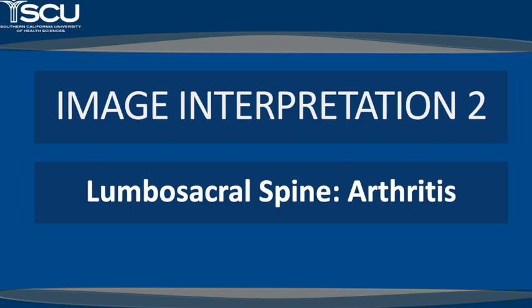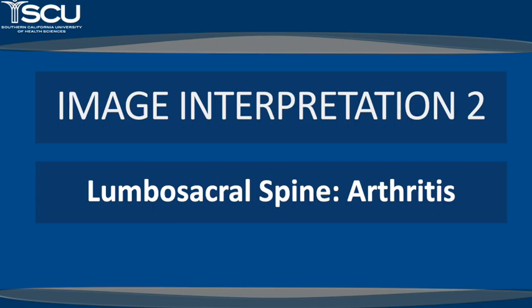Interestingly, laboratory findings are usually normal, which can make it challenging to differentiate osteitis condensans ilii from other conditions such as seronegative spondyloarthropathies like ankylosing spondylitis and osteoarthritis. Radiographically, osteitis condensans ilii is characterized by a triangular sclerosis of the ilium adjacent to the sacroiliac joint. This sclerosis may be unilateral or bilateral. Notably, the sacroiliac joint itself often appears normal, without any evidence of erosions or joint space widening. The sclerosis can regress over a period of 3 to 20 years. The images on this slide demonstrate unilateral osteitis condensans ilii, with the characteristic triangular sclerosis adjacent to the sacroiliac joint.